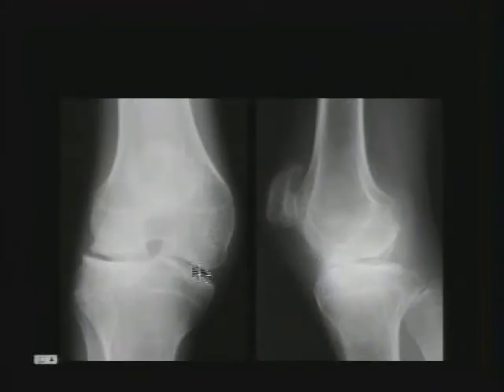Well, in a knee, you get that prominent intercondylar notch, but be careful because if you just flex your knee and you do a tunnel view, it looks a little prominent. So it has to be kind of a standing AP view of the knee to say that the notch is prominent. Notice that there is involvement of both medial and lateral compartments because this is a general disease, and that there's squaring of the patella. And so those would all be good signs for hemophilia.